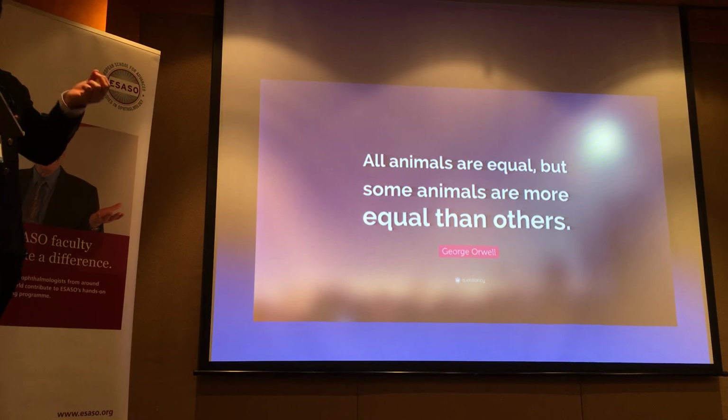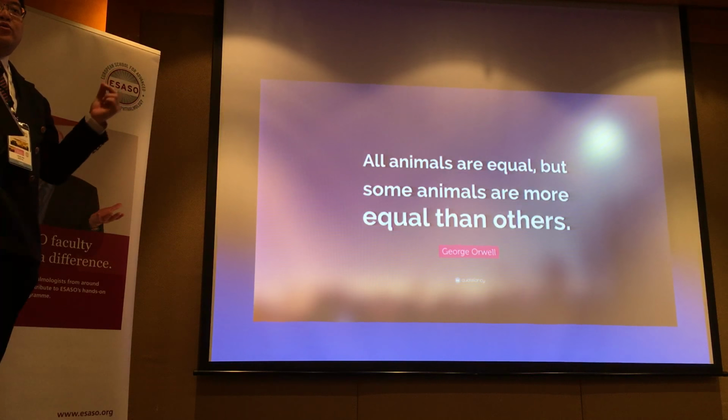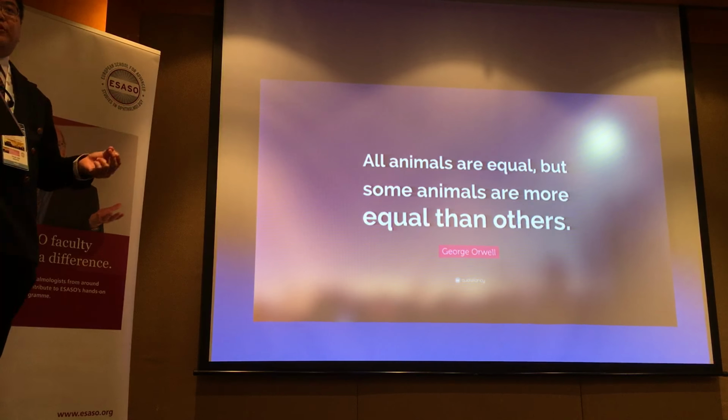And something of equal intensity, and remember intensity can vary just by the gain, the settings that you set, as well as by the patient's cooperation. It varies even from visit to visit. Be careful of that. Not all spots are the same.